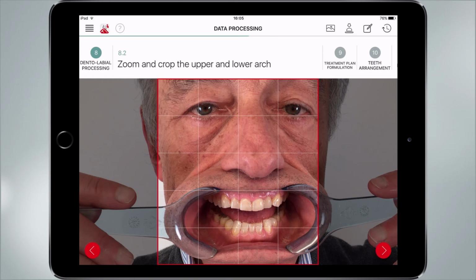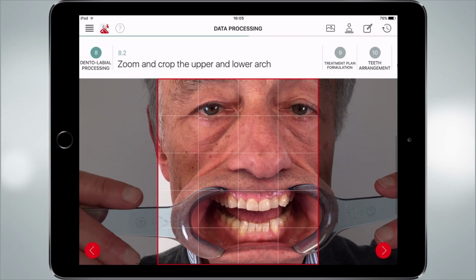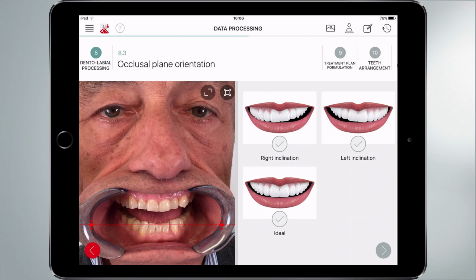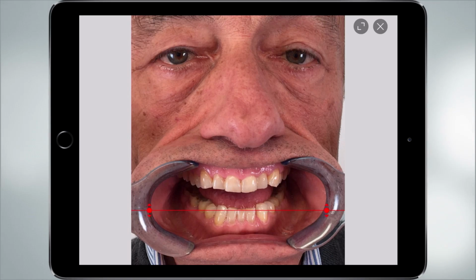Now if you, with your rehabilitation, want to follow the eyes, you can go ahead in this case, and you have the chance to see that in this situation here, of the two cuspids, this one is longer than the other one, and the molars are more or less in the same situation. So you can avoid moving the occlusal orientation so much.